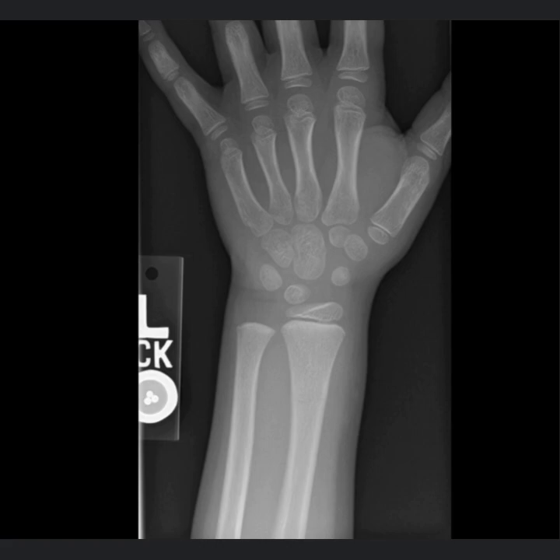Again, today's presentation will be a video presentation, so you can log on to the YouTube channel and see the x-rays and the images that we discuss during the presentation itself. So if you're logged on or looking, here's an x-ray of a patient that came in.